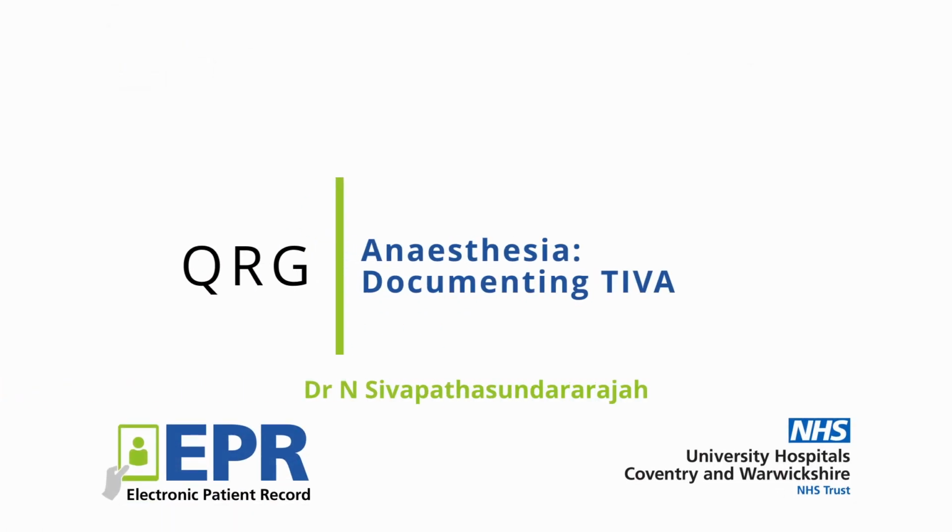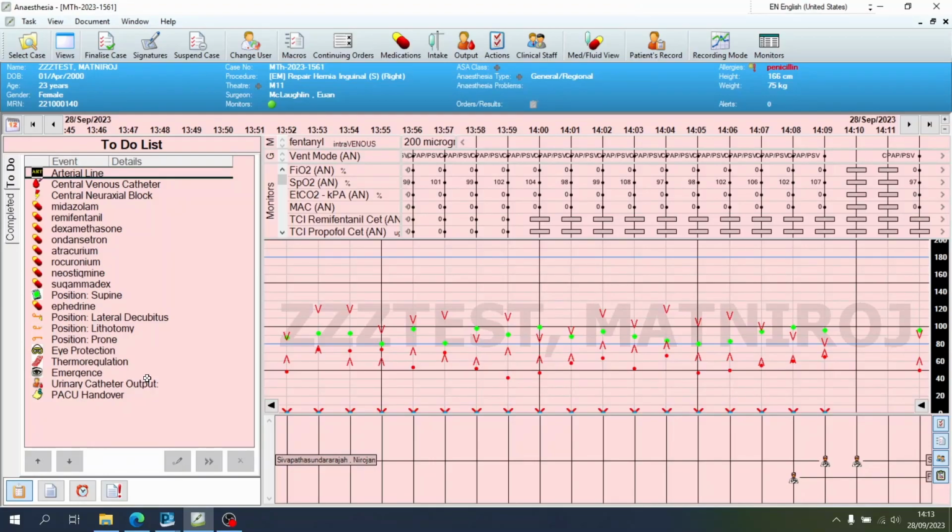Anesthesia. Documenting a total intravenous anesthetic. Unlike an inhalational anesthetic, where all the records of the anesthetic agents will be pulled through from the devices attached to the SA anesthesia solution, in a total intravenous anesthetic, the pumps are not networked and therefore the data cannot be pulled through to the solution.